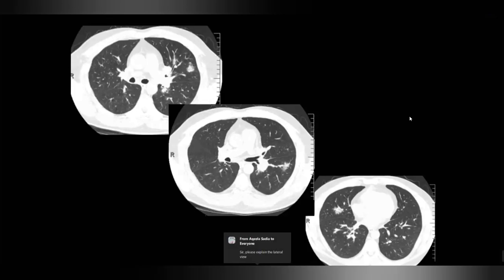It could be a central obstructing mass. Before you go to the differential, what is specific about these nodes? The irregular margins, they are more suspicious for a neoplastic lesion. So next I would go for contrast. Before you go to presumptions, these nodes are irregular in margin, spiculated in margin. What about the location, is there any specific distribution of these nodes? They are randomly distributed, one on the right side and two on the left. So this is adjacent to the vessel. Here they are adjacent to the vessel. Here maybe adjacent to the vessel. So what do you call this distribution?